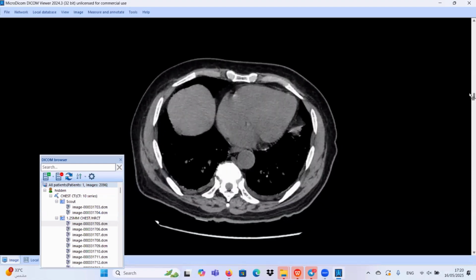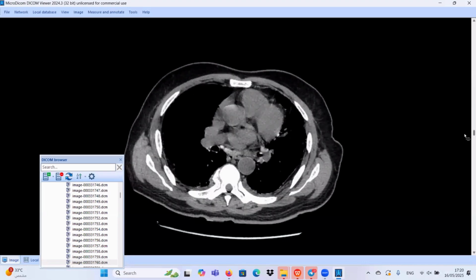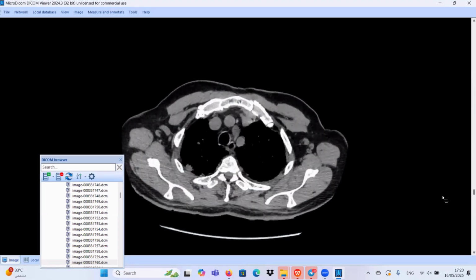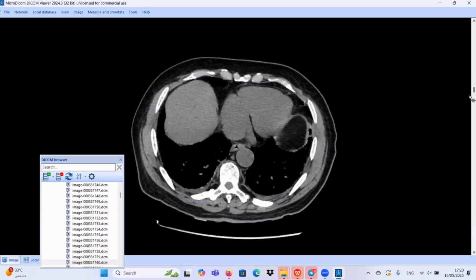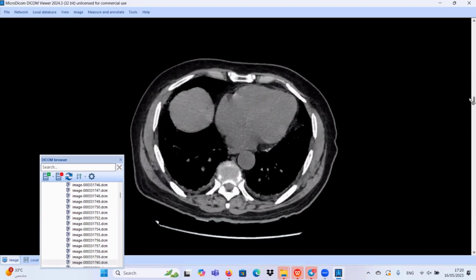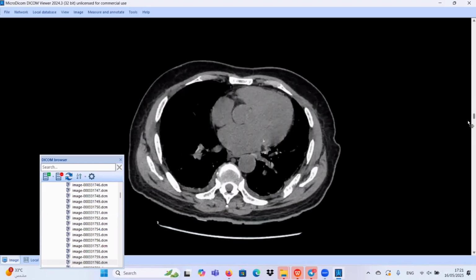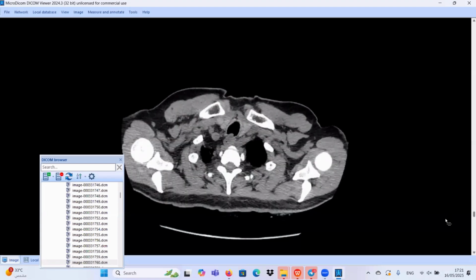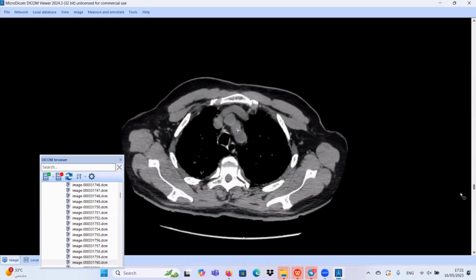I think we don't have significant pericardial effusion apart from this area. We have a minimal bilateral pleural effusion. Is there anything you want to add in this case? Sir, I'm looking for the esophagus. It is not patulous and not dilated. I'm looking for any lymphadenopathy. Perfect. The esophagus is not dilated. Is that correct? Yes, it is not dilated. Okay, that's good.